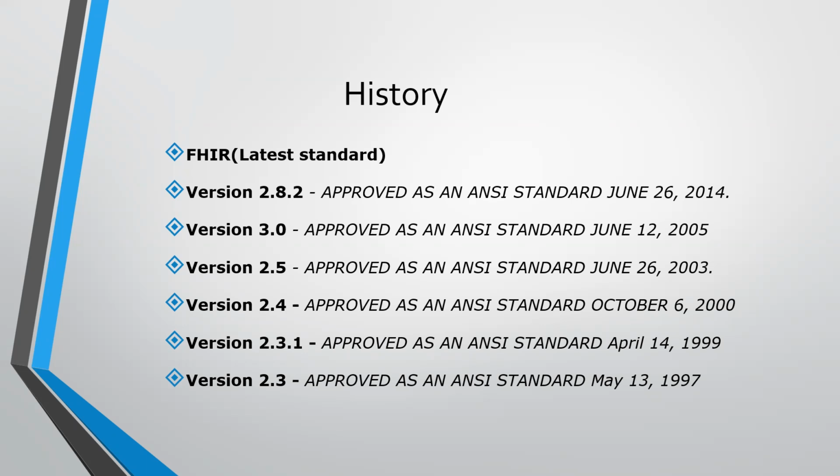So if you are jumping into the data integration industry in healthcare today, you need to be aware of HL7 version 2, and you need to learn FHIR slowly, so that you can be compliant with the healthcare industry. These are the two things that would be needed. But HL7 V2 is the go-to option as of today for integrating between different healthcare applications. People don't use FHIR for the things where HL7 is being used today.